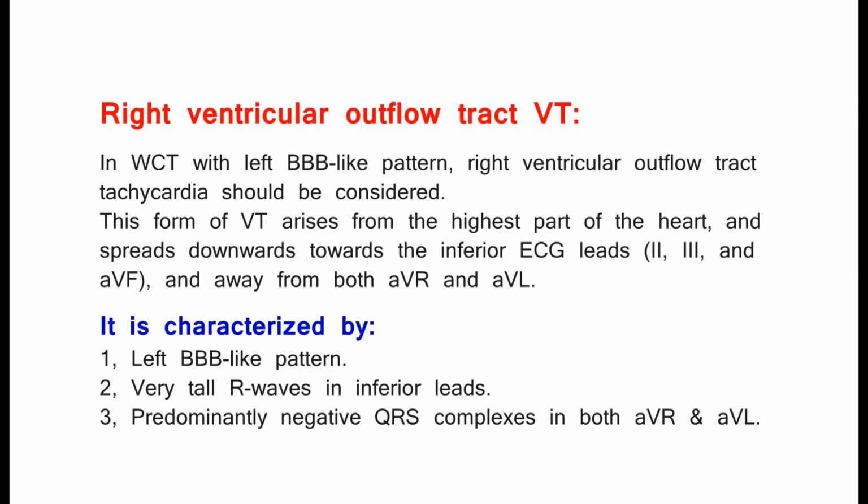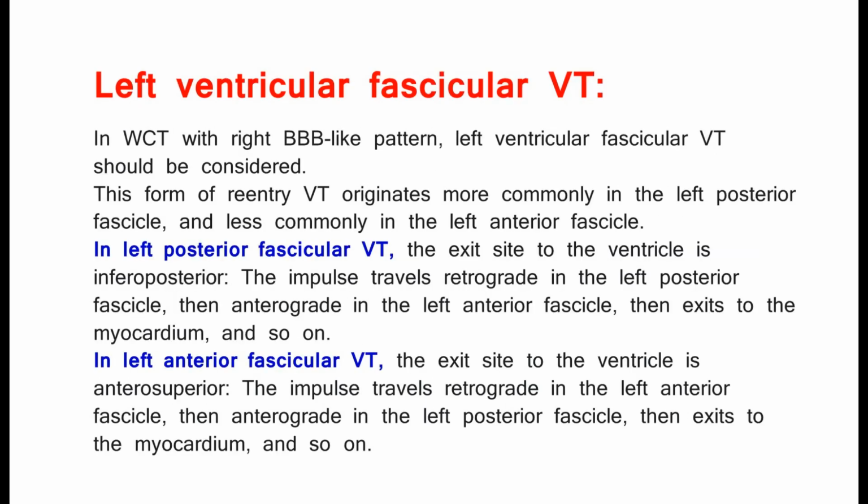It is characterized by 1. Left BBB-like pattern. 2. Very tall R waves in inferior leads. 3. Predominantly negative QRS complexes in both AVR and AVL. Left ventricular fascicular VT. In WCT with right BBB-like pattern, left ventricular fascicular VT should be considered.